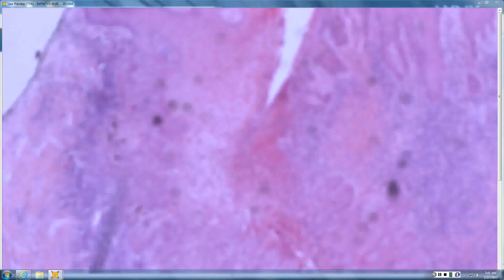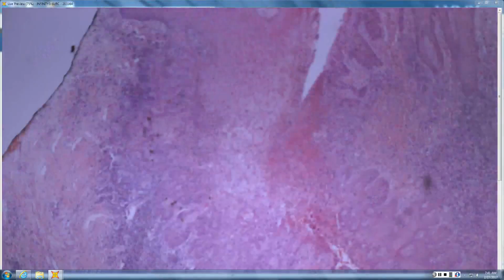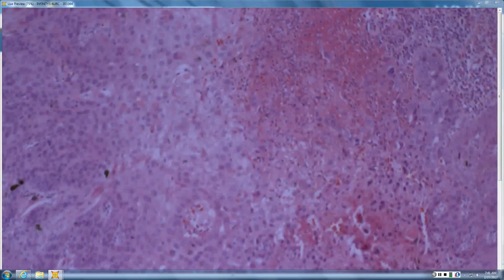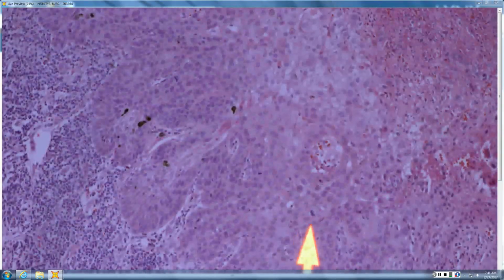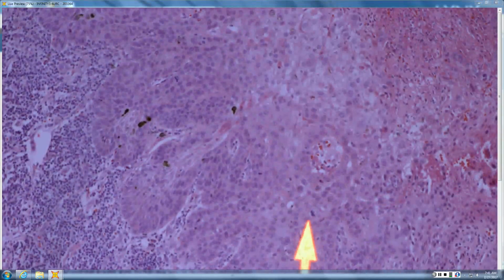And then what has happened in this wart? We're looking like there's some atypia in there as well. There's some mitotic figures I don't really like too much that you're pointing out with a nice arrow. So it may be undergoing some squamous changes in there as well. Exactly. So this is invasive squamous cell carcinoma arising in the setting of condyloma.